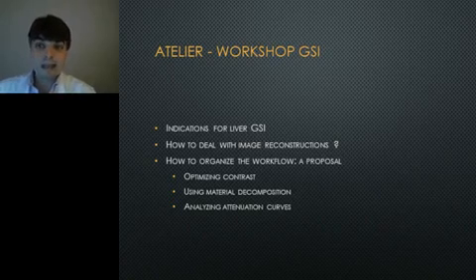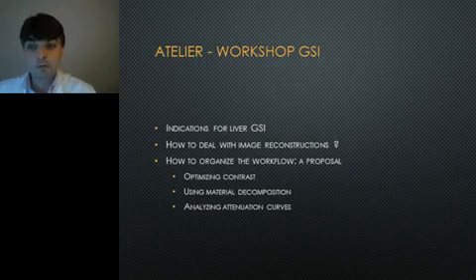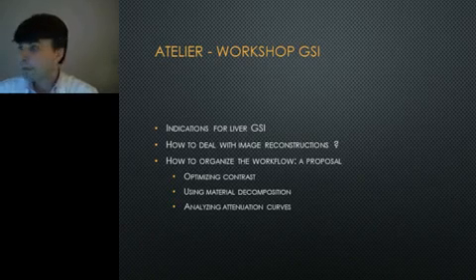So in that kind of workshop, maybe I could illustrate some indications for liver GSI and how to deal with image reconstructions and how to organize the workflow. And this is just a proposal. My proposal for organizing a workflow in GSI technology and spectral technology is first, how you can optimize contrast. Second, how you can use material decomposition and how you can even analyze the attenuation curves to decompose the materials.